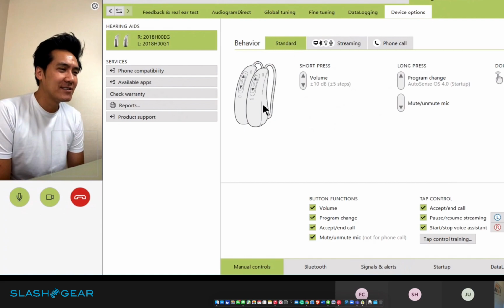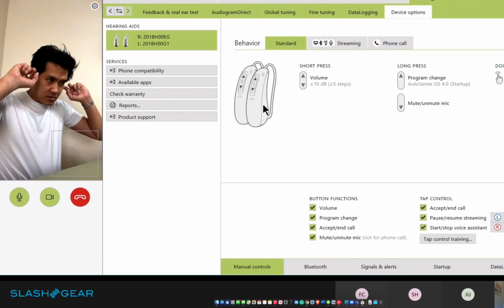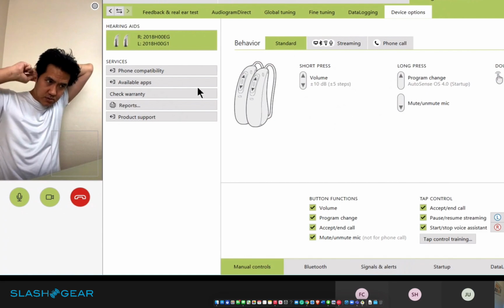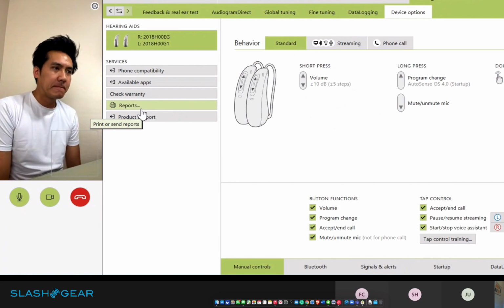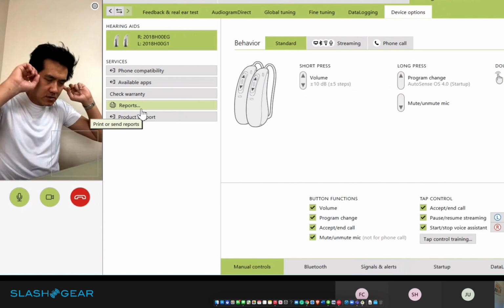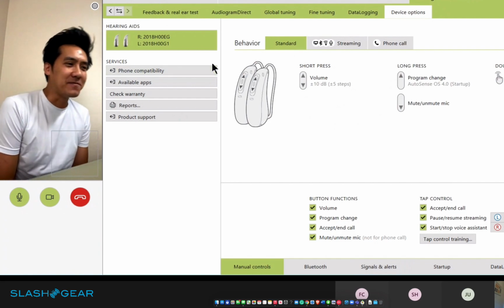And you're very welcome. So I guess I'll go ahead and save everything. So I saved the changes, so I enabled the mute function. I can send you the report after we call. Okay. I'll email it to you so you have what the different buttons are doing for you, because I don't expect anyone to remember, especially as there's a lot. Yep. There are a lot of functions for 4 buttons.